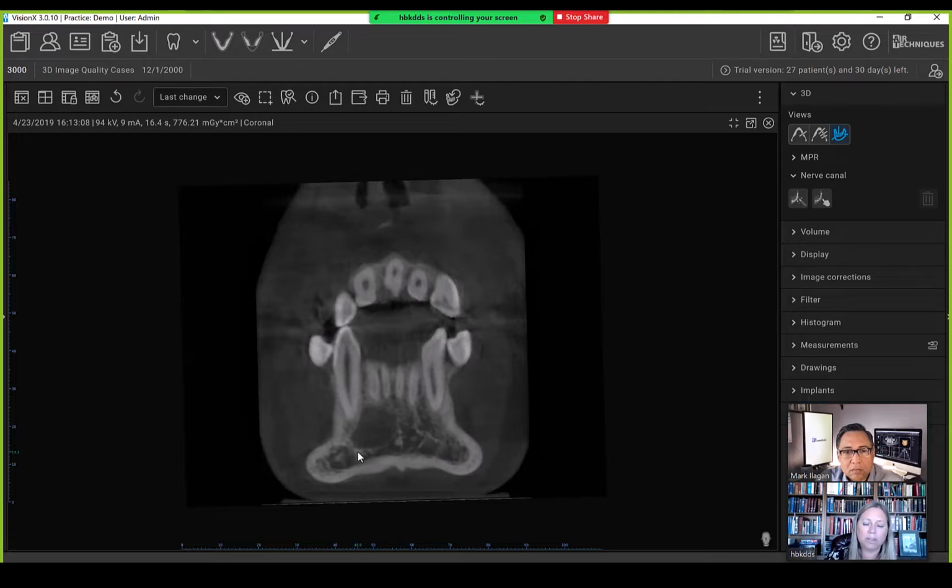So my number one for this would be a simple bone cyst, which is also known as an idiopathic bone cavity. And those are essentially empty spaces. So when the surgeon comes in, he's going to know immediately what it is because it's going to be an empty space. And once he scrapes on the bone and it starts bleeding, it's going to fill in with bone and essentially heal it. So I always say, if you're going to have a lesion, this is the one you want to have. Okay. Because it's not epithelial lined. It's really more of a pseudocyst.